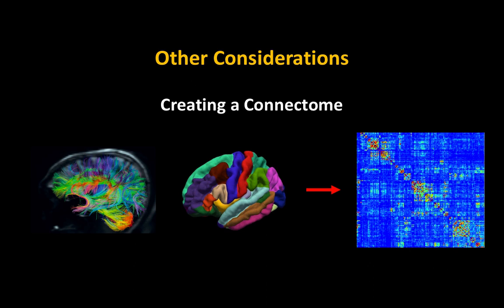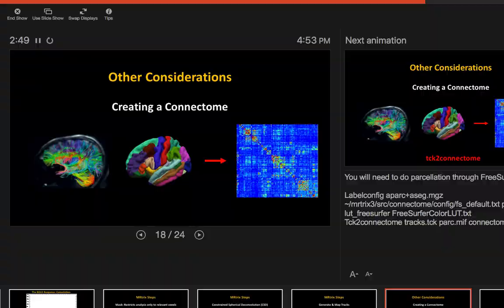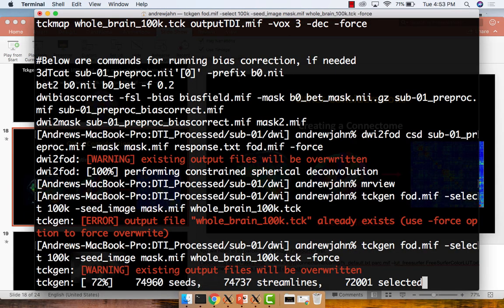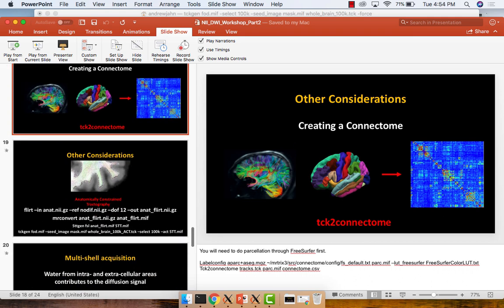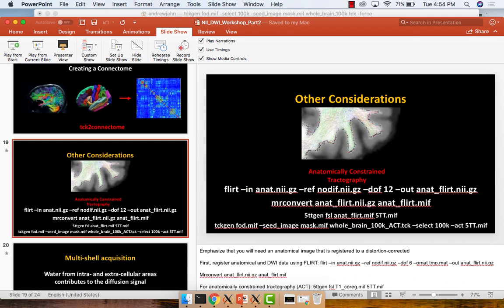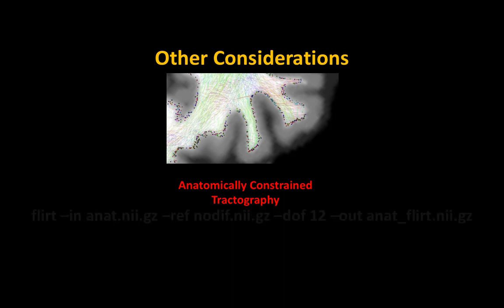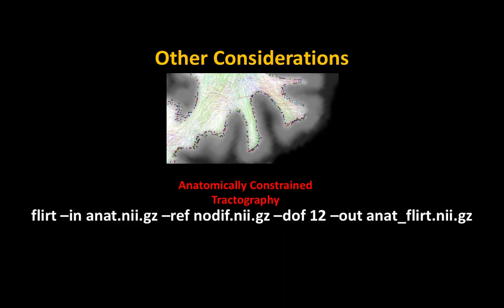Just so I have this recorded, and at some point I should put this particular code up, because what I'm showing you now isn't written out explicitly on the MRtrix website. You have to do a little bit of digging, but it does work. Let's see here. I'm just going to put all these different lines here.